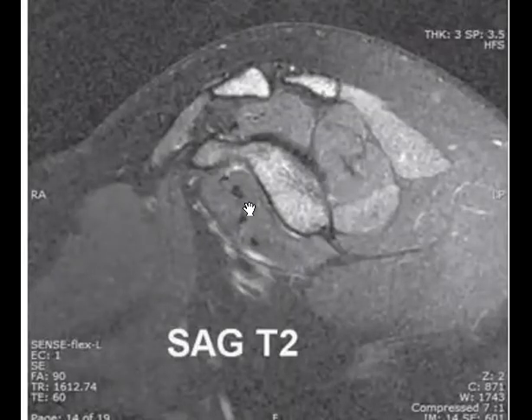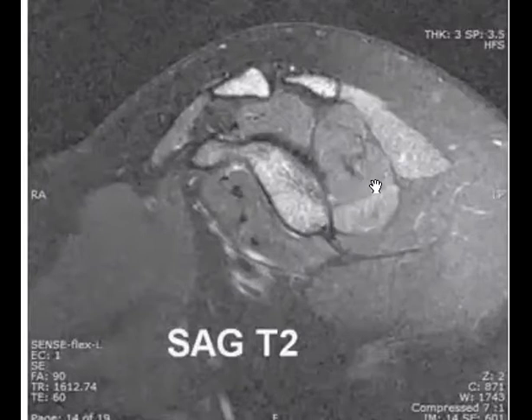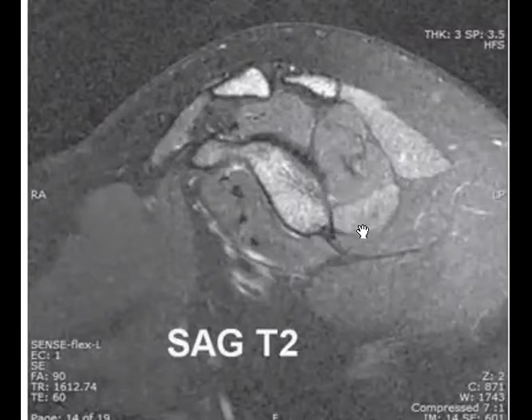So I see that Jermaine again. Okay, nice. There is edema in the teres minor. You mean this, right? This patient has no history of trauma. So you can find this edema with no history of trauma. And this should be fat suppression. Okay? So revise your answer again, Nermin. So this edema in T2 sequence.